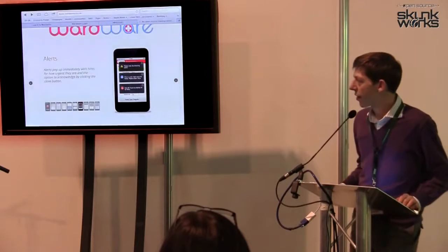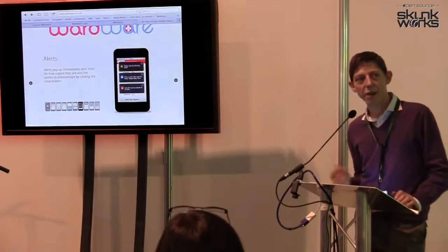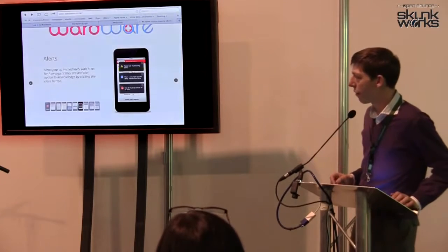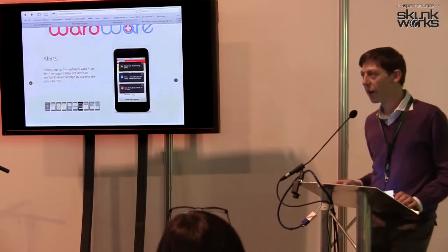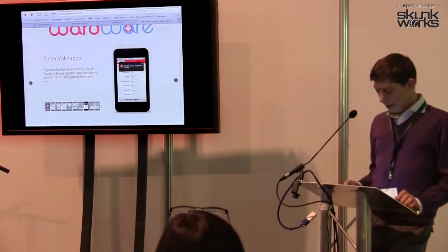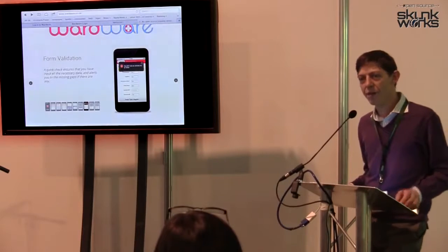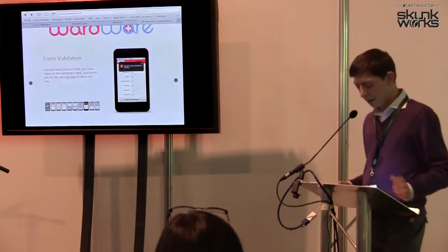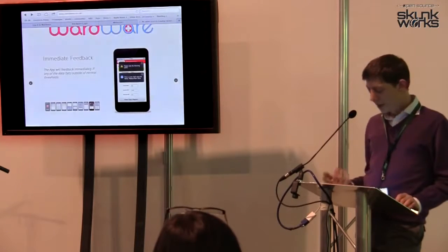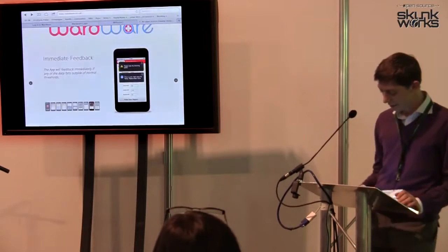And it gives some instant feedback. So the moment you put something in, if you need to be alerted to a high value or a low value or a value that you haven't put in, if you're not doing your observations or you've missed something out, it reminds the clinician to capture that bit of information, and you can acknowledge that alert quite easily just by clicking on the little X on the screen. And it validates all the data to make sure it's all within thresholds and values according to what your trust thinks are appropriate, fully configured, fully localized to each individual trust policy. And as I say, again, instant feedback there with quite clear pop-ups for the nursing staff.